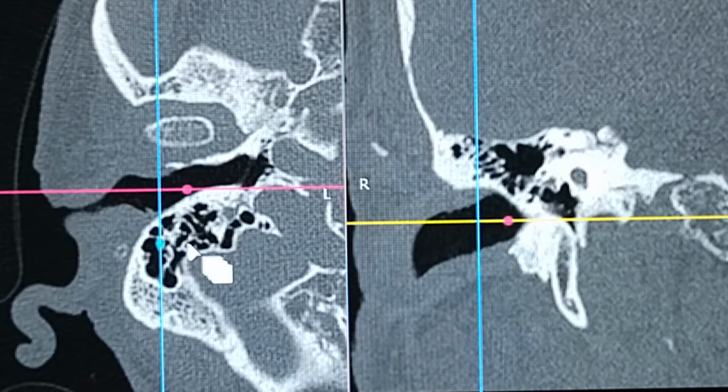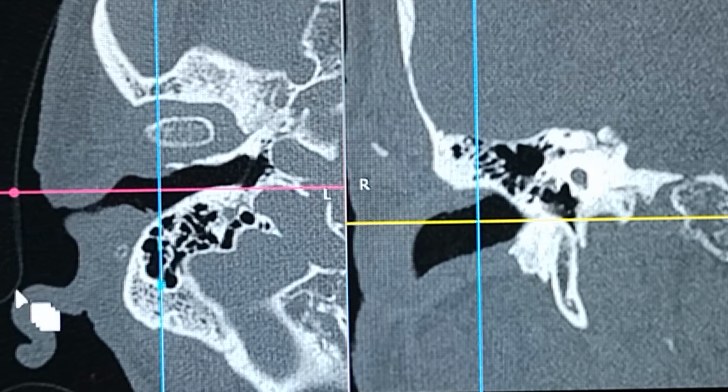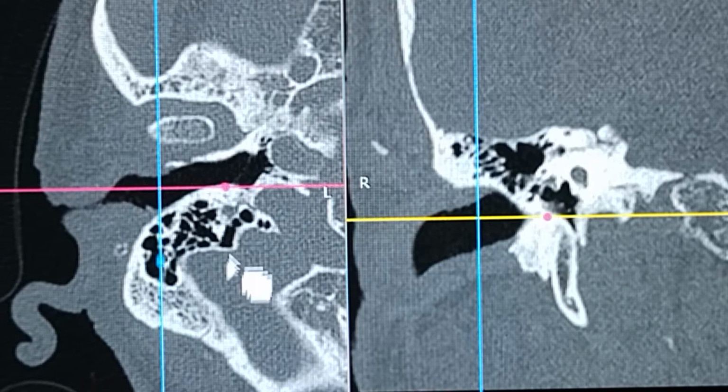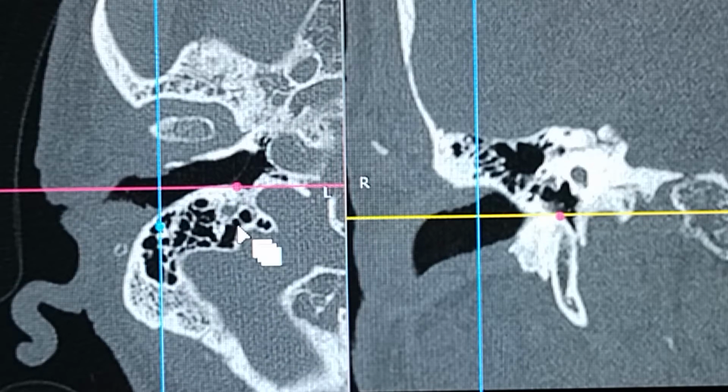This is the mastoid air system. You gotta enter the area from here, because in case of MRM, this is the auricle. You can see you have to retract it and you gotta drill from here. But this is way too inferior. You're gonna still go more superior, and I can show you the exact area where you can drill from the cortical mastoid, the cortex of the mastoid bone. So we're gonna keep going up.